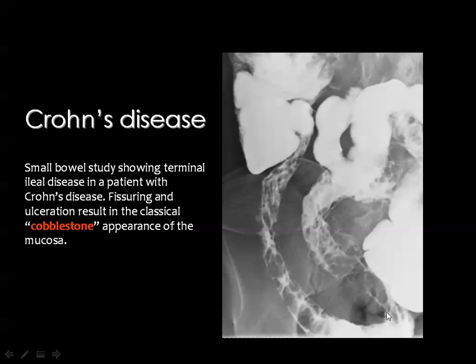One of the criteria of Crohn's disease in the terminal ileum is what is known as the cobblestone appearance. This appearance is the result of the disease causing damage to the mucosa and ulceration of the mucosa. Then the healthy mucosa will hypertrophy to compensate for the function of the damaged mucosa, and this hypertrophied mucosal island will result in this cobblestone configuration.